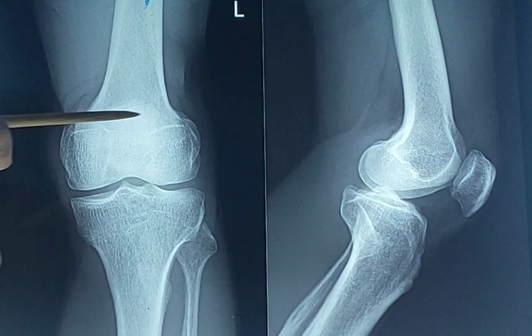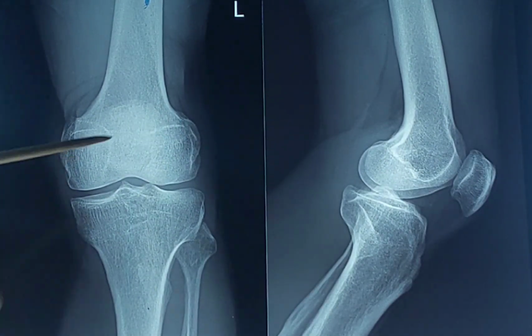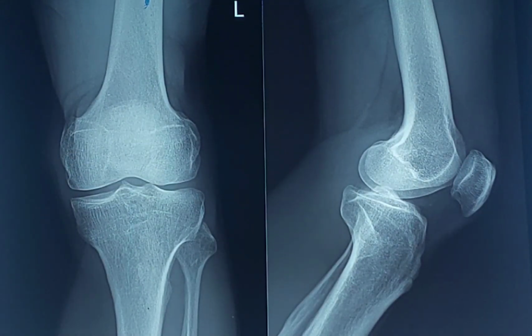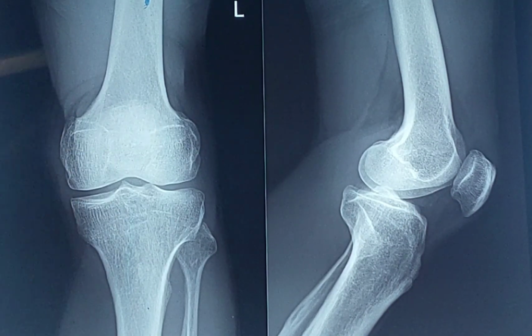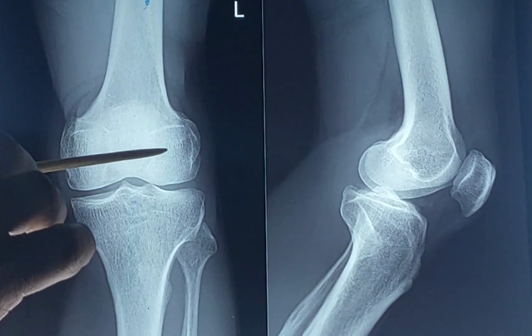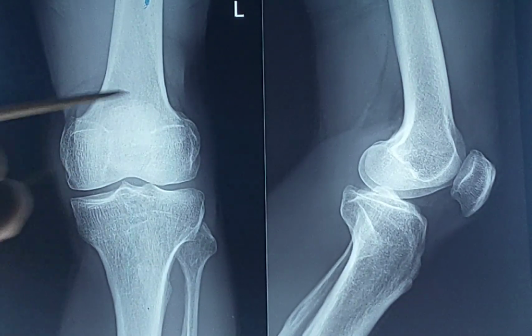joint. I told you of these two condyles of the lower end of the femur. The lateral condyle is more massive. Not only that, the lateral condyle is projected forward to some extent, and there is an inherent tendency of lateral displacement of the patella, but it is prevented by mainly two factors. One is the massive lateral condyle, which projects forward to some extent and prevents lateral displacement.